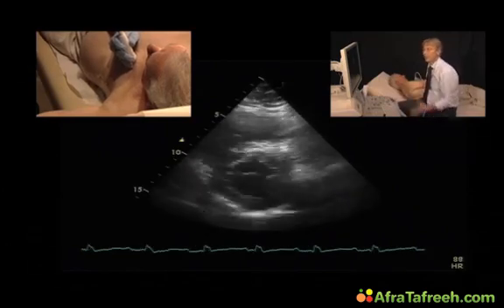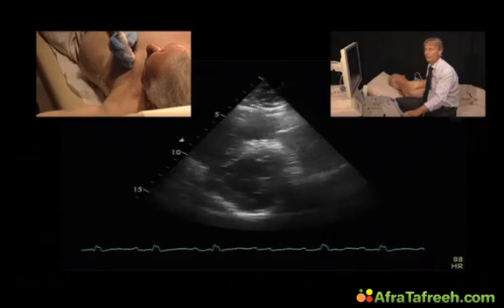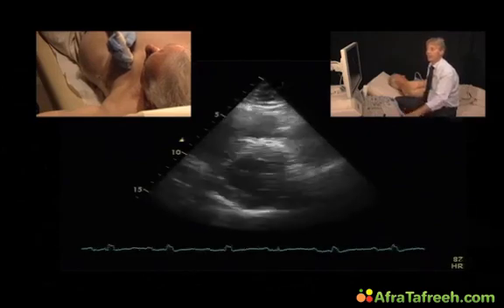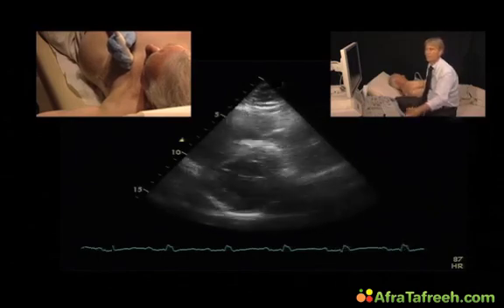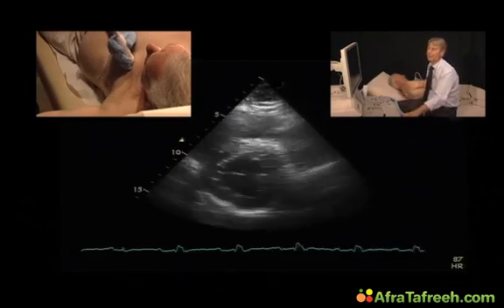Certainly hypertrophy can also be asymmetric in patients with hypertensive heart disease, but this altogether looks very much like hypertensive heart disease. So if you look at the clinic of the patient as well, and you know that the patient had hypertension for many, many years, the diagnosis is quite clear. Okay, so are you ready for the next case?